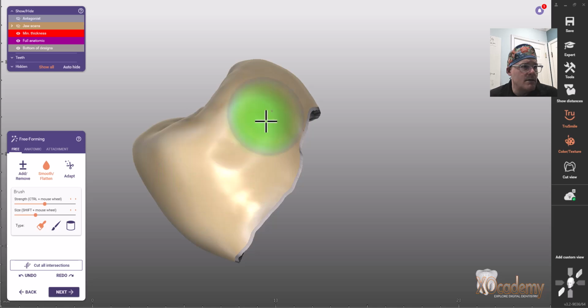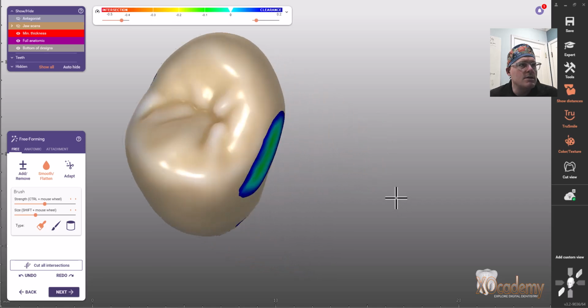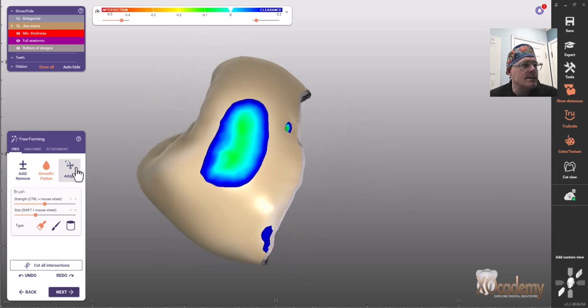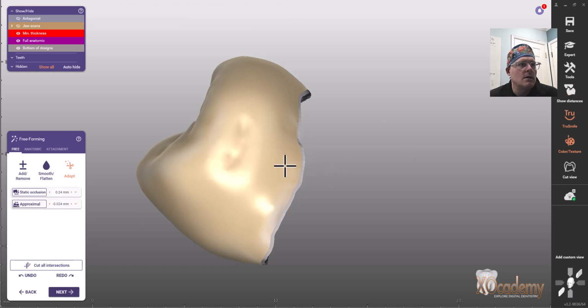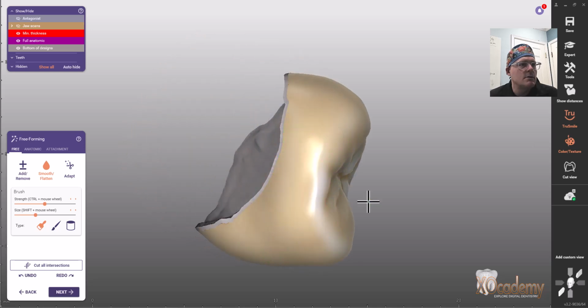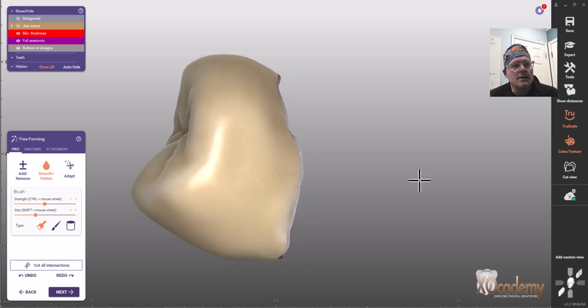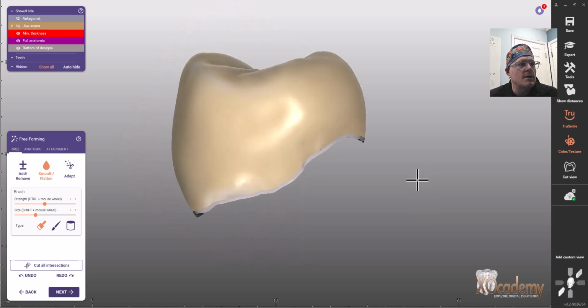When I've got my adjustments done, I click smooth and flatten. I'm just going to smooth that area so we don't have big hard lines in between them. And you can see then I'll click adapt again, A proximal, and smooth again. And that's probably all we need to do. So we're going to get good contacts. They're nice and smooth on the sides, and our contours are great.